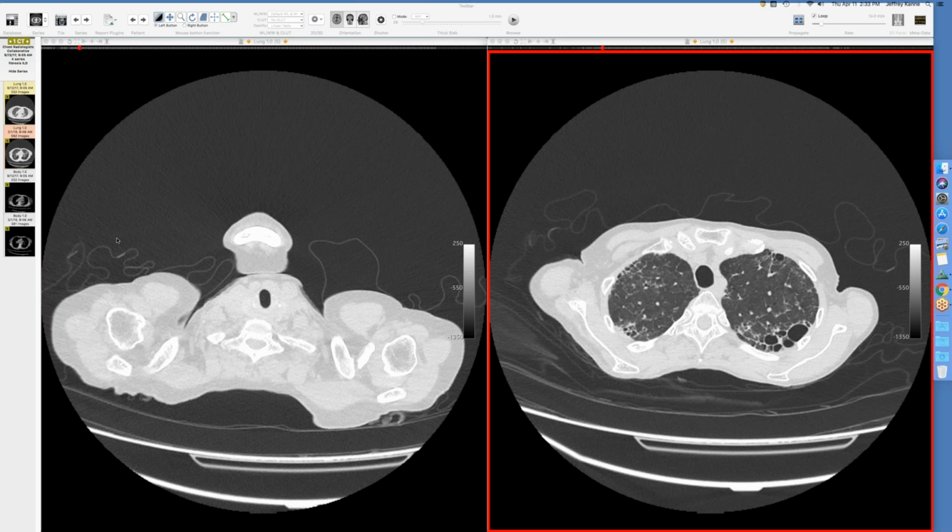Because honeycombing is really what's left when the pulmonary lobule collapses down as there's progressive injury and collapse of the alveoli. It's really the small bronchiole that's been left behind, and everything collapses around it. That's why we struggled, luckily we don't have to as much anymore, with traction bronchiolectasis versus honeycombing. It doesn't really matter. But to me, that's what the so-called honeycomb cysts are. We're just stuck with poor terminology that's not the same as the pathology.